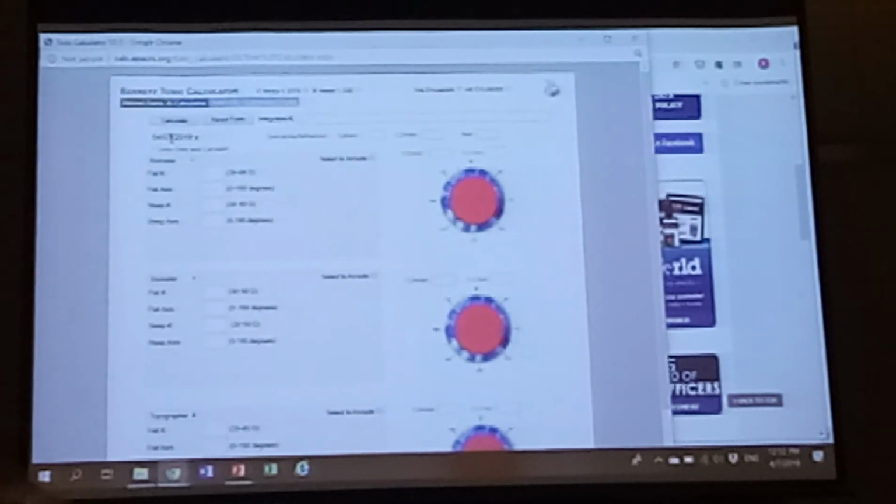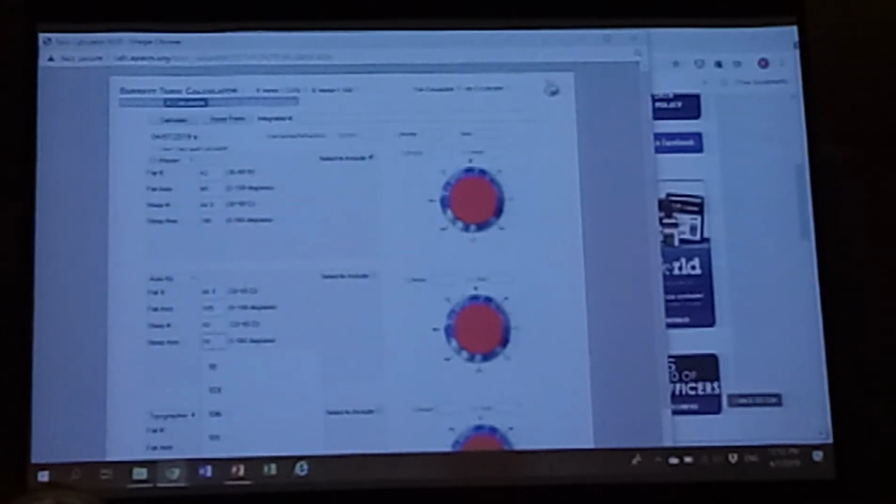So the first set I want to put in, if you select your biometer, which was the IOL master in this case, you key in 42 at 90, 42.5 at 180. That's the first set of data I put in on the previous page, if you remember. Now I use 3 sets of Ks. My second set of Ks is typically from an autokeratometer. And let's say for this, say it's 42.3, and say it's at 100. And put this at say 43 and 10. Now you've also got to click this box here called select to include.